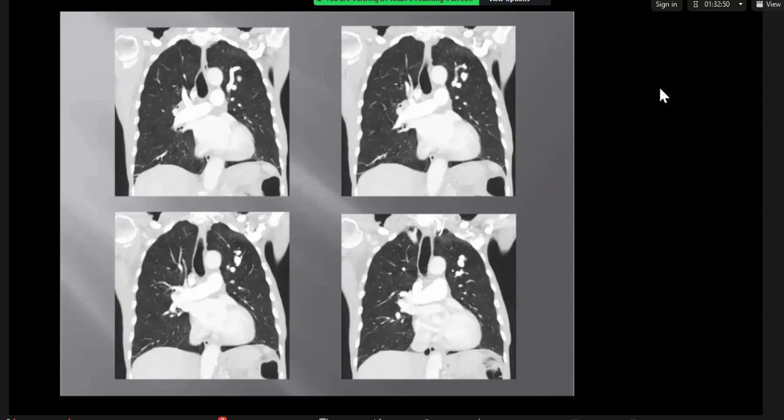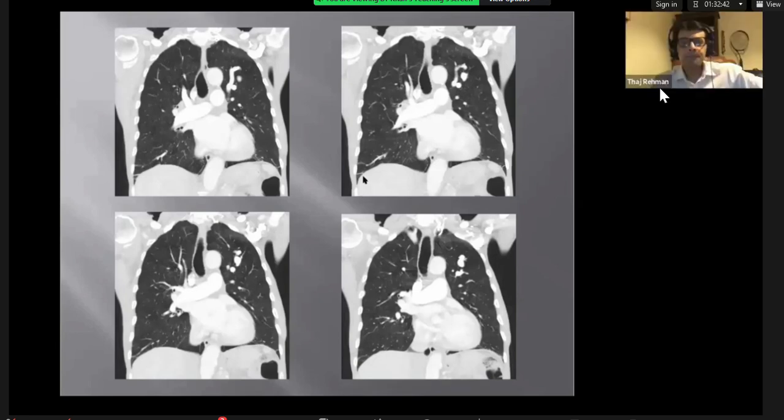I can see a tortuous, long, dilated vessel arising around the opacity down to the hilum. So for pulmonary AVM, the chest X-ray abnormality would be a nodule with dilated blood vessels. Train your eyes to identify vascular structures on X-ray.